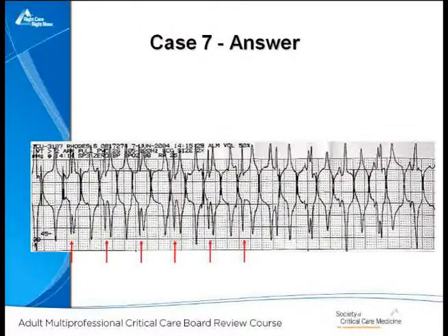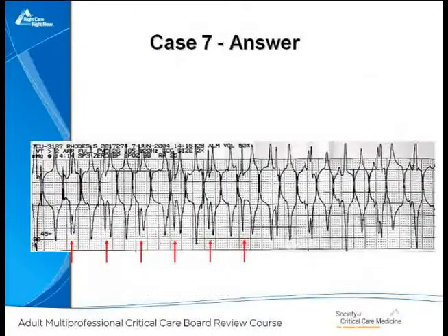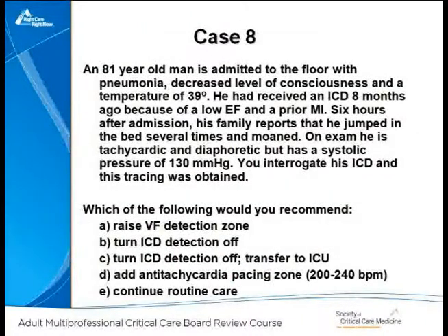It's interesting that there is some literature on this in that about 5 to 10% of referrals to electrophysiologists are for artifacts. So again, it is something that you want to be aware of, something that people on the boards like to put on there because it's something you should know, and it's something where you can definitely harm a patient if you don't recognize it. So when you see a rhythm strip tracing, think artifact.